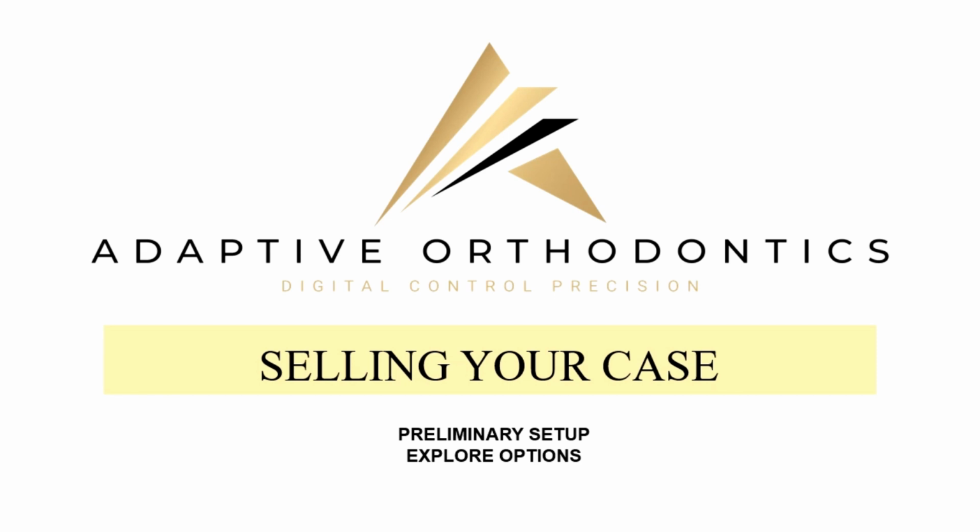In this segment, you will learn how to do a quick preliminary setup. The setup at this stage does not have to be comprehensive, but should have sufficient detail to treatment plan, cost, and present your case. Supplementary note, this video is designed to run quickly for efficiency of delivery. But remember that you can replay and pause as often as you please.